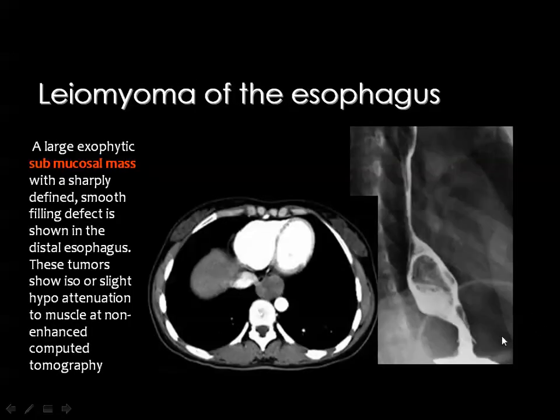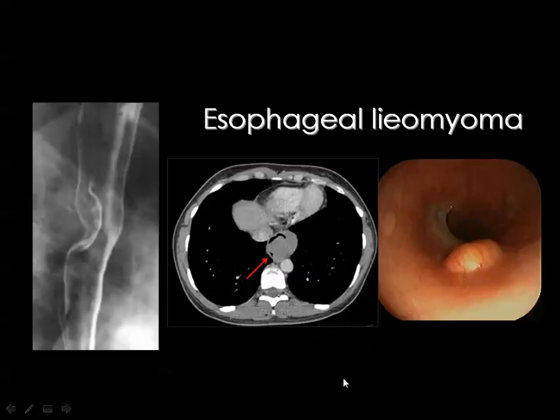material. If you look at the esophagus from one side, you can see expansion of the lumen, while if you look on the opposite side, then you see reduction of the lumen with exophytic extension of the tumor. By CT, one of the characteristic criteria of leiomyoma is the compression of the esophageal lumen at the edge of the tumor.